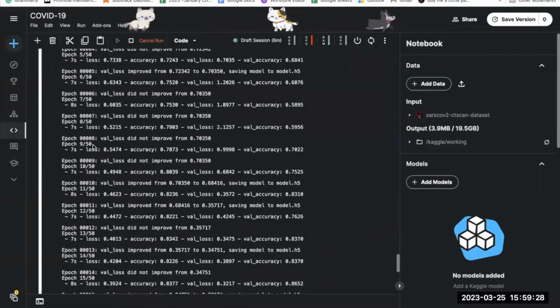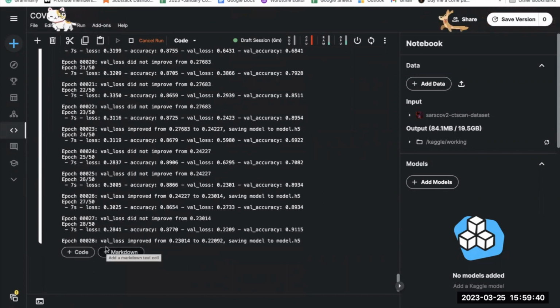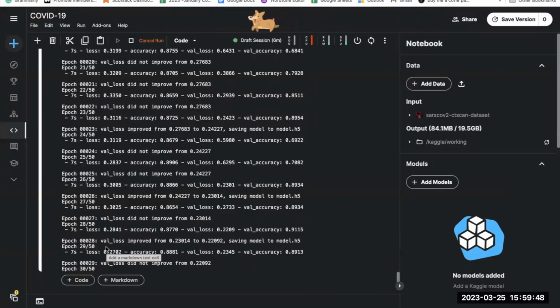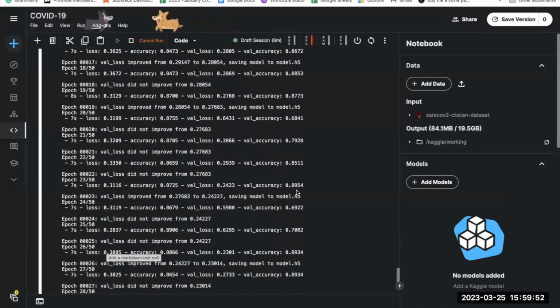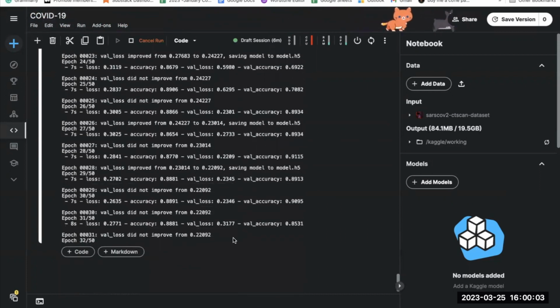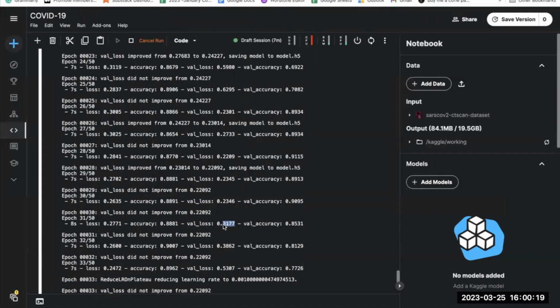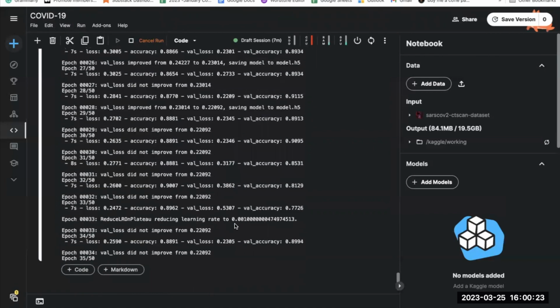And now let's see. We were at epoch 11, and now we are at epoch 28. Let's wait for some more time. As you can see, the validation score is also increasing as we go down the line. It also decreased at some point, which was 0.782. The validation loss also increased, and accuracy also. I need this number to be as close to 1, and this number as close to 0.